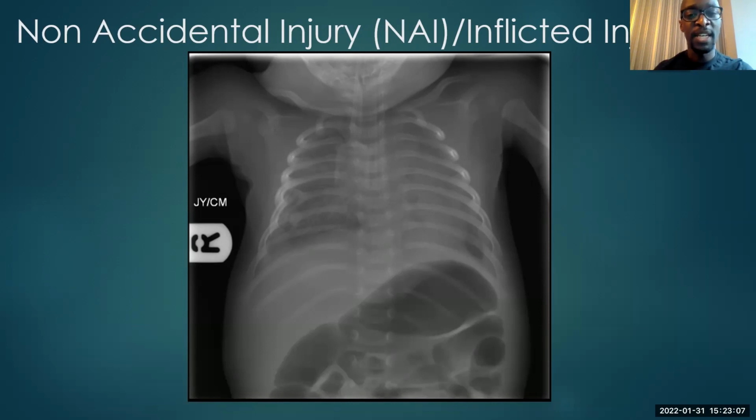Roughly, you start to see signs of radiographic healing between 7 and 10 days, roughly speaking. It depends a little bit on which bone you're talking about. But as a guide, we say 7 to 10 days. So if you start to see evidence of healing, then you'll say that it is at least 7 days old. But there is no way anyone is going to put words in my mouth to say that this happened on day 3 and it was by a twisting injury. We don't really use that language. We say it's acute or it's healing. Is there evidence of healing? Is there periosteal reaction or callus? Yes, no. So we're very, very deliberately cautious in the language that we use when we describe these things.